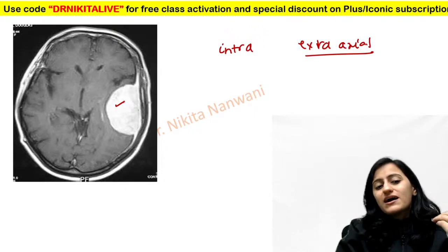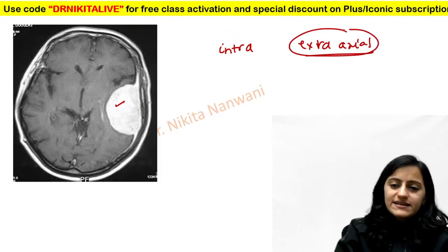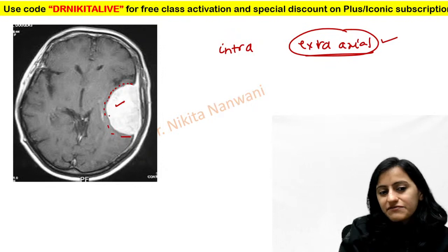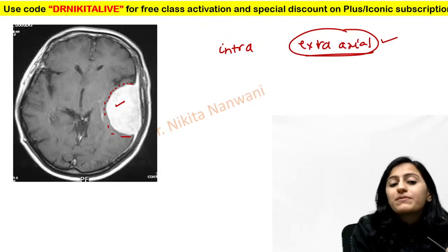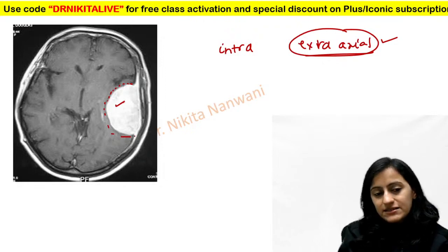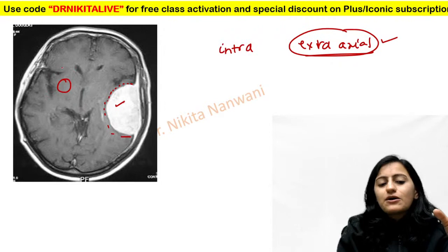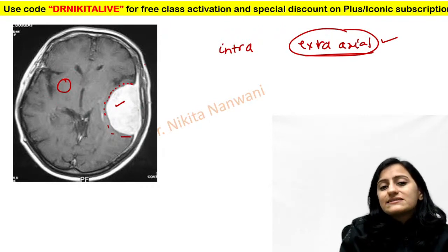Is it intraaxial or extraaxial? This is outside. Yes, this is an extraaxial lesion. You can see the brain surface is here. You can see a CSF cleft. CSF is black here, surrounding the tumor. The brain is compressed. This is extraaxial. If it was intraaxial, within the brain, it would be surrounded by brain throughout, right? So this is the extraaxial lesion.